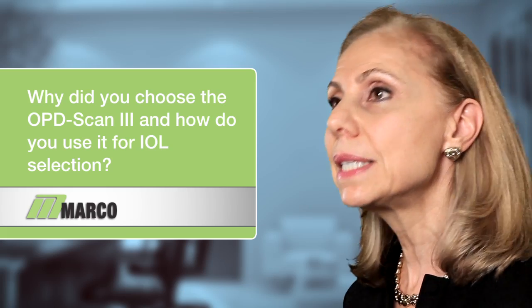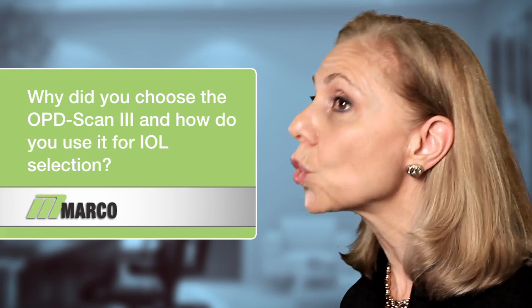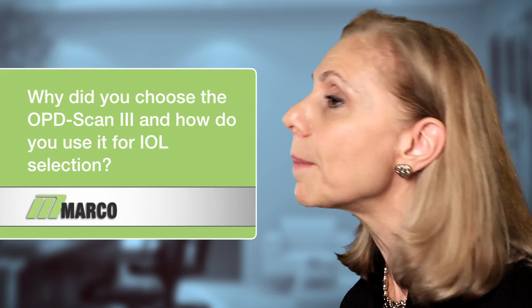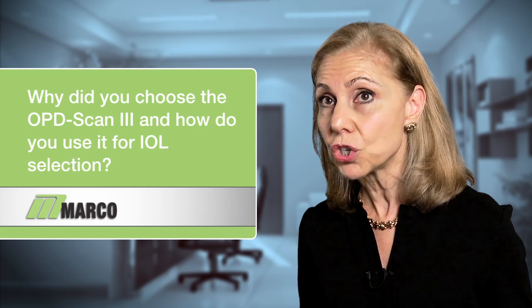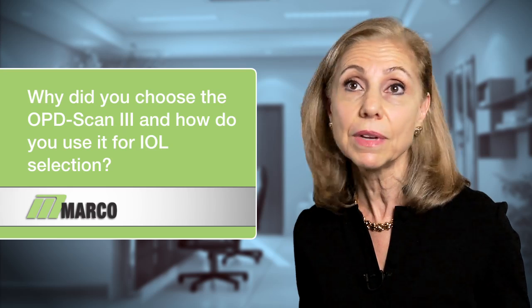Also, I am able to demonstrate these maps in the exam room to the patients. So both the patient and his or her family member are able to understand their disease process or their ocular numbers so they can best accept my recommendation, whether it be a toric implant, a monofocal implant, or a multifocal, or even an accommodative implant.